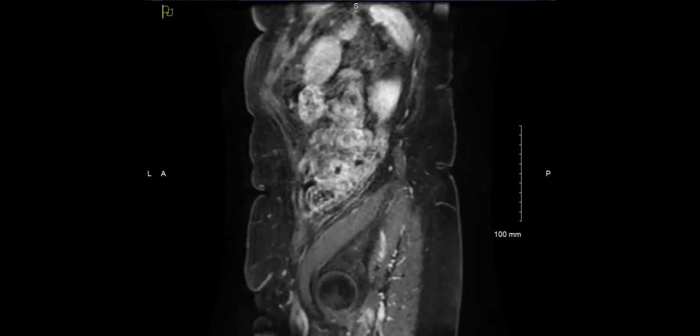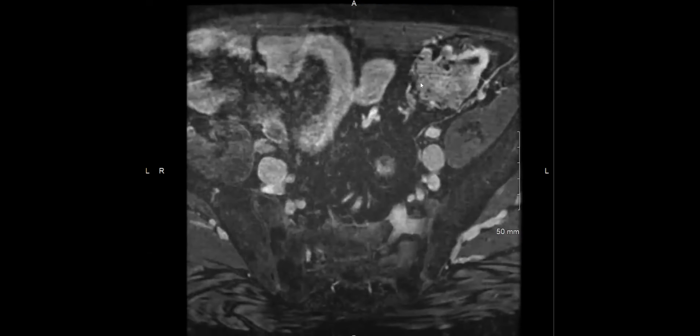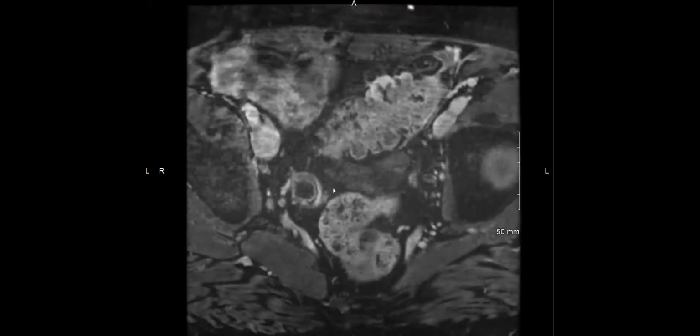And then again, interestingly, about a week, maybe 2 weeks after this case, you're not going to believe it, but this is another urogram, and we were reading it, and the patient incidentally has this big bladder mass with other urothelial things. And then we noticed this.